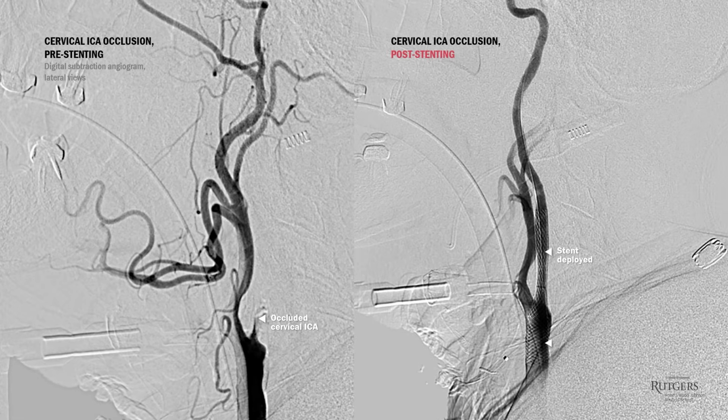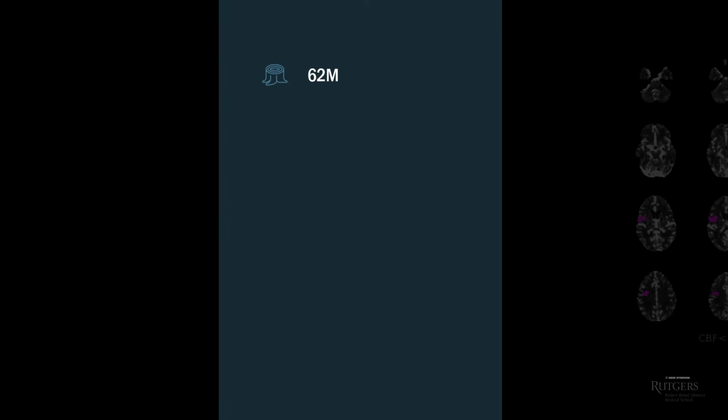In the interest of full disclosure, I should mention that this is individualized medicine. There's no high-quality evidence for something like this, and certainly not everyone with such pathology should be acutely stented. Case in point, here's another example.